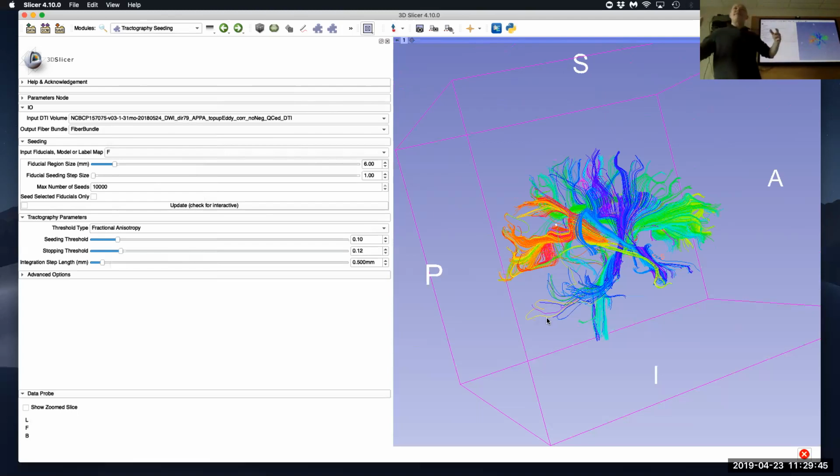Otherwise, I'll just add that we recently had the experience with this when it was a data conversion problem. Yes, that can also be. So the tracks look really wonky. They just look kind of truncated and twisted because there was a conversion problem. You may remember from last session, where I talked about measurement frame and gradient directions and so on that are in the DICOM file. That was exactly such a thing, where what was in the DICOM file was, I think, correctly taken out of the DICOM file, but not the measurement frame. And when we then got that incorrectly DICOM converted data, it looked all wrong. Now, when we did our conversion, it looked all good.